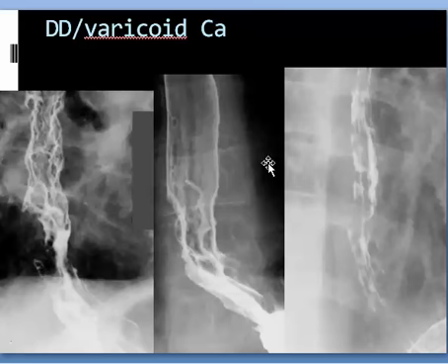It seems as if like varicose, but it is due to creeping gastric carcinoma in the submucosa, eroding and causing lobulated and nodular appearances along the outline. So it is definitely, the appearance is different. Thank you.